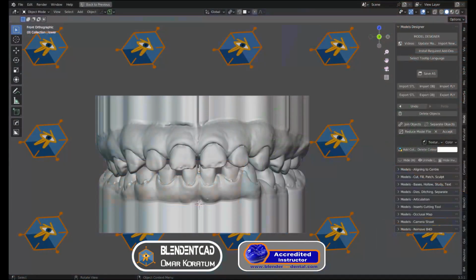Hello everyone. In this video, I'm going to show you how I designed soft tissue crown lengthening guide using Blenderfordental.